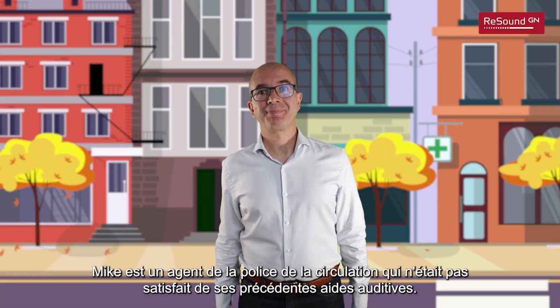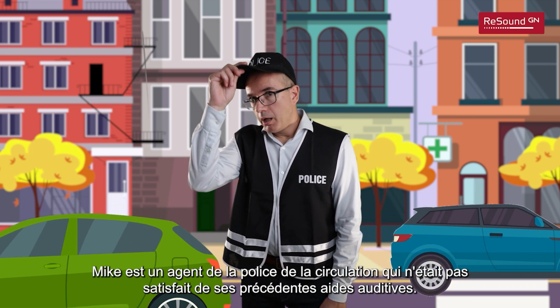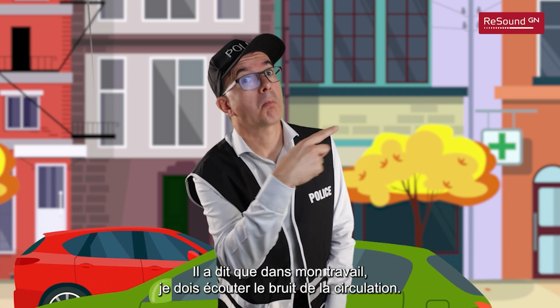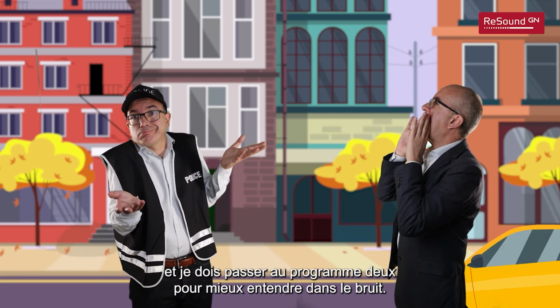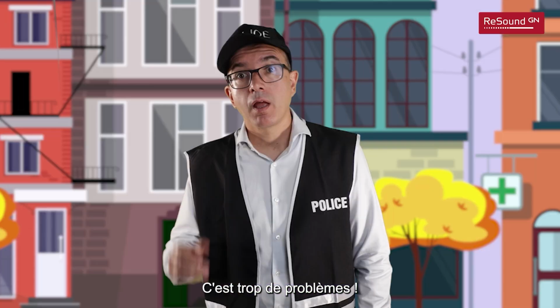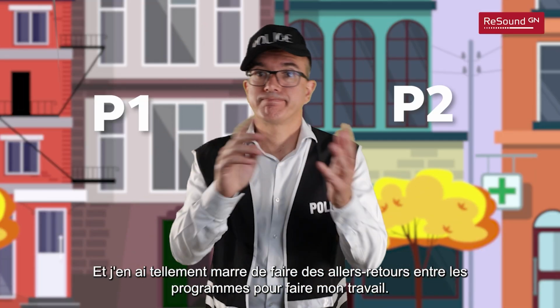This is Mike. Mike is a traffic police officer who was not happy with his previous hearing aids. He said, "In my job, I need to listen to the traffic noise, and for that I use program 1. My problem is that when someone talks to me, I cannot hear very well, and I have to change to program 2 to hear better in noise. This is too much trouble, and I'm so tired of going back and forth between programs to do my job."